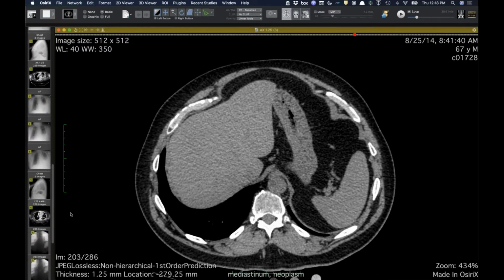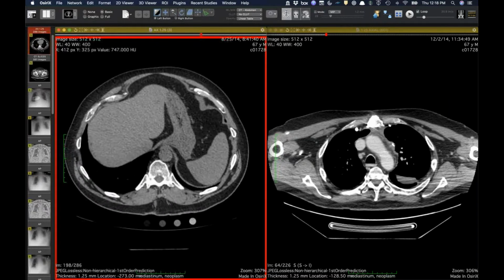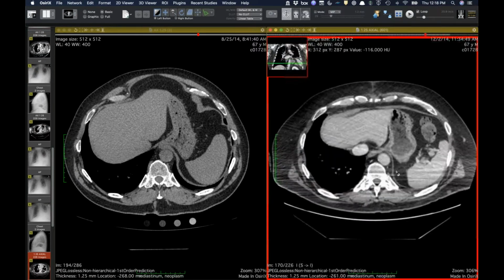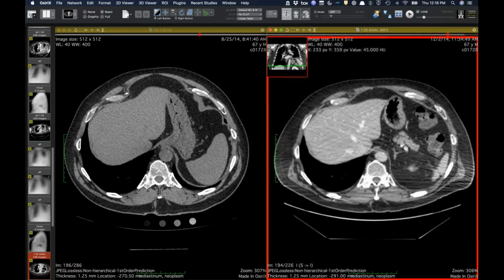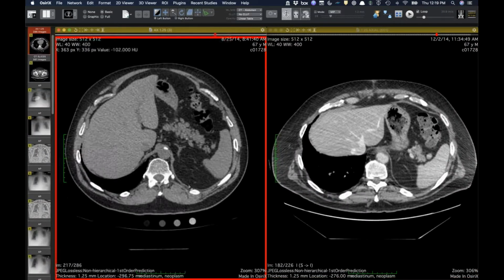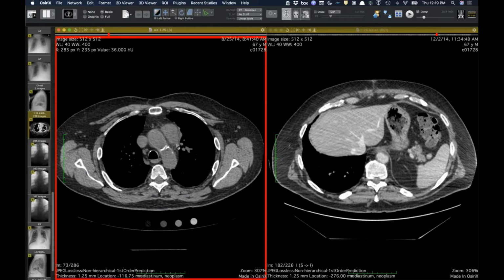This was several years ago, but you can see now, and I know how David in particular always talks about the paper from the University of Washington on thickness of the crus, you can see how the left crus has thinned over time with the chronically paralyzed left hemidiaphragm. But he's been on a PD-1 inhibitor and doing quite well from his metastatic melanoma. So that was an unexpected surprise from the anterior mediastinum, especially with no known primary.